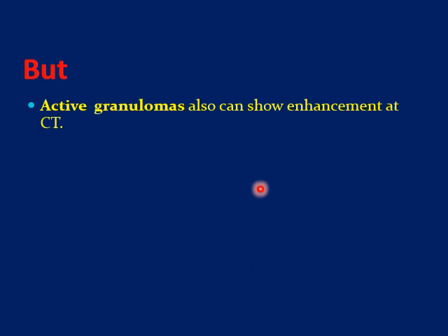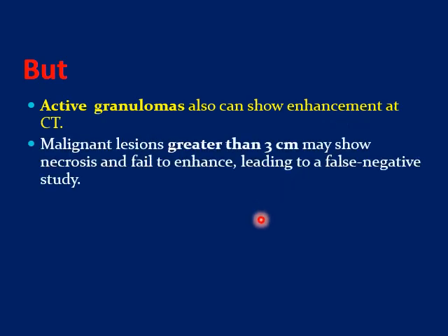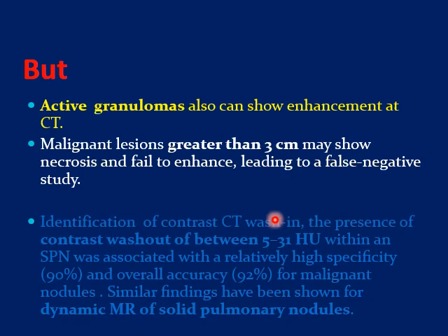But keep in mind also that some active granulomas may show marked enhancement at CT. Malignant lesions greater than 3 centimeters may show internal necrosis and fail to enhance, giving you a false negative study.